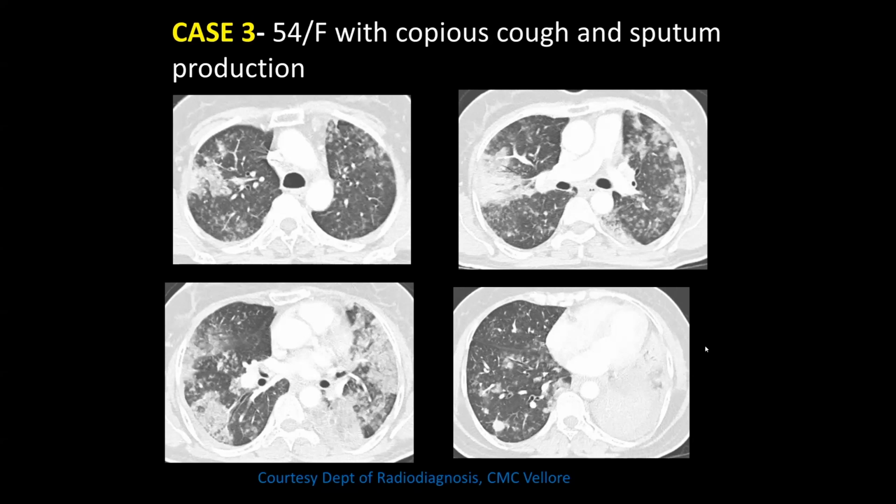Okay, so that's good. So what we are finding here is you can see there are areas of ground glass opacities, consolidation, air bronchograms happening, multifocal, diffusely involving both lungs. You can see a nodule which has kind of spiculation, multiple small ground glass nodular areas also. So this is like a multifocal adenocarcinoma, probably a mucinous type. Imaging wise, that's something we can think. So I think this was actually an adenocarcinoma, definitely yes, synchronous multiple.